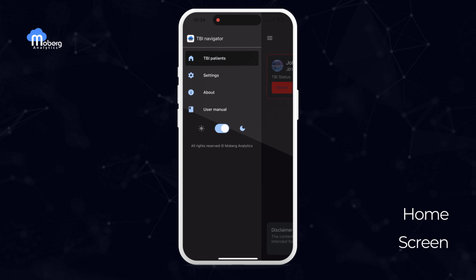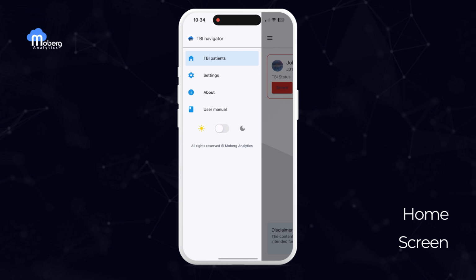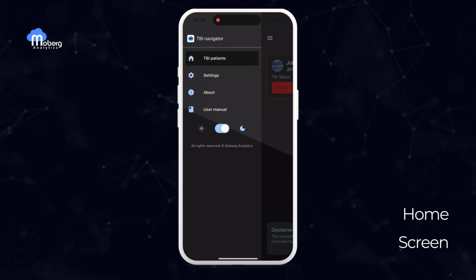In the top left, we have the hamburger menu, which provides additional navigation options. From here, you can access the Settings, About, and User Manual pages. Just below the user manual, you'll find a toggle to switch between light and dark mode for the app.